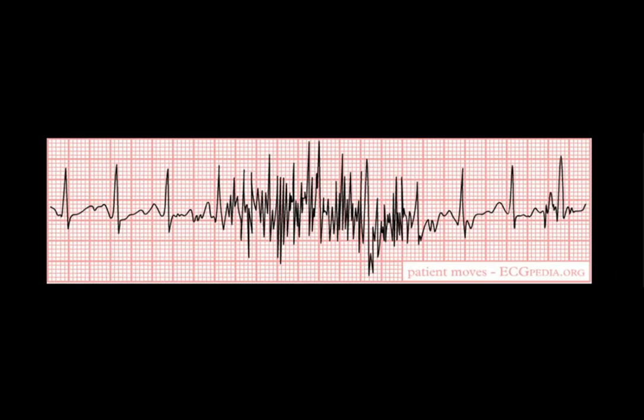Well, when I take a look at this, I can see a wave here with a QRS complex and there's a P wave and there looks like a QRS there, but then I get into a bunch of this artifact. And this is not a great EKG or ECG to be able to interpret or measure anything from. So go ahead and hit the print button again and see what else you would be able to find. So this is not a good readable strip.